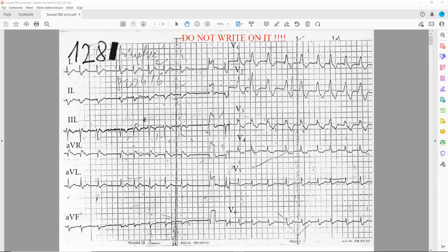So you don't need to see the F wave, the fibrillatory waves. It's enough, doesn't matter how wide the QRS is: arrhythmia, no P wave, atrial fibrillation. If we do have arrhythmia with sinus P wave, that's sick sinus syndrome. If we do have arrhythmia absoluta with a different P wave, that's a multifocal atrial impulse formation.